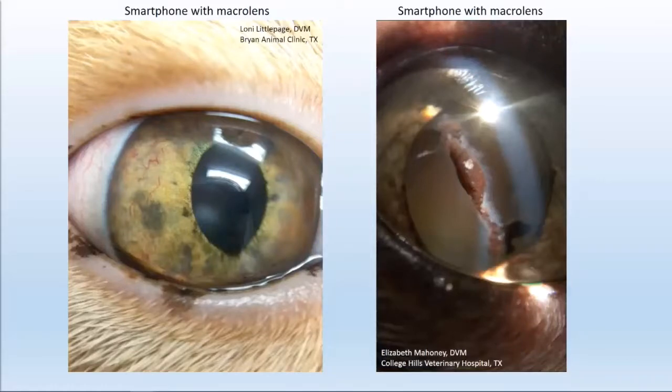This is nodular iritis. There are specific conditions that we think about, and I can give fairly accurate information at least about the iris because it's a perfect representation of the disease. I don't know what the skinnier photo is. It's the only veterinarian who's used the slit lamp technique with a direct ophthalmoscope to highlight an anterior lens capsule opacity, but it was perfect, and it's perfect for this lecture. So we'll talk about how to do that.